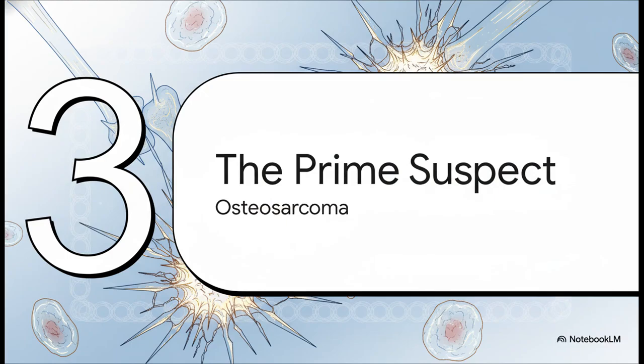All right, so we've got our key clues, the border and the pattern of destruction. Let's use them to build a profile of one of the most notorious bad guys in this world, osteosarcoma.